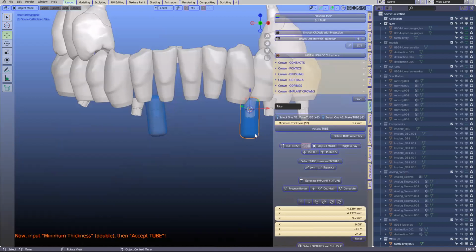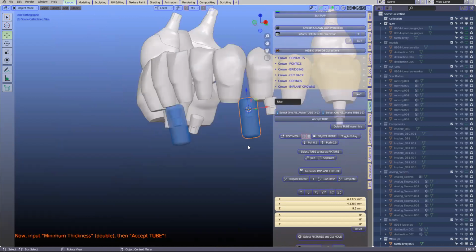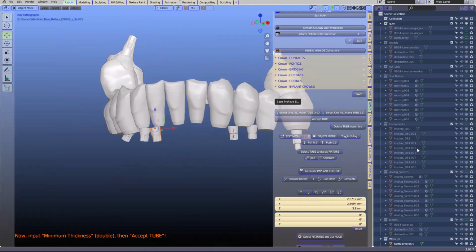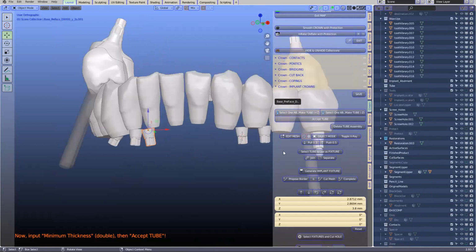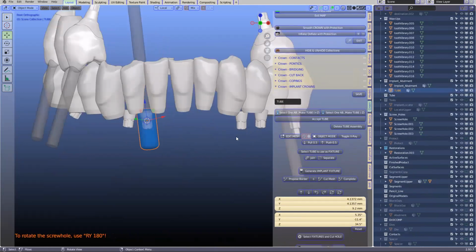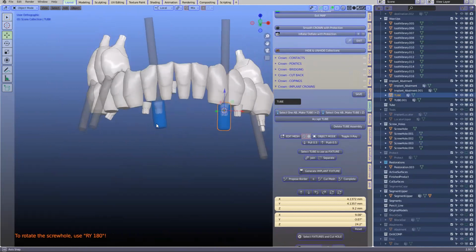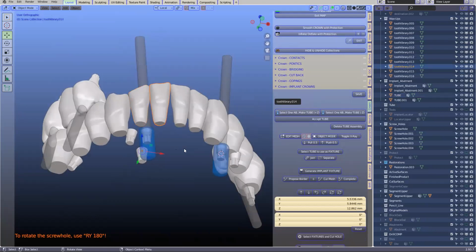Actually, I think the scan bodies were almost touching each other. What is that? The scan bodies were almost touching each other. No, I think it was the tooth 4-3. Those two. What I need is I need to bring these in. Yeah, so this is working, okay. Okay, so this is it. We need to curl that one in. So I'm going to hide a few.